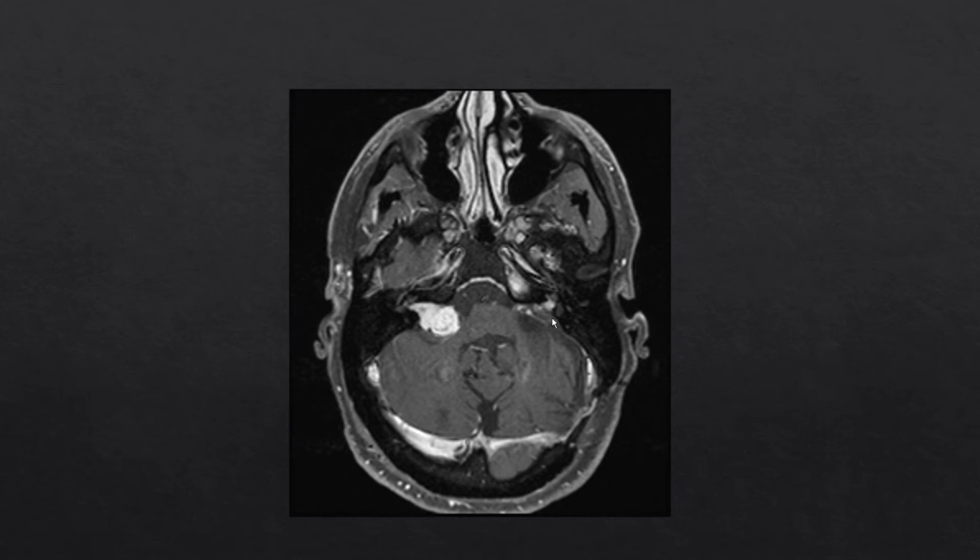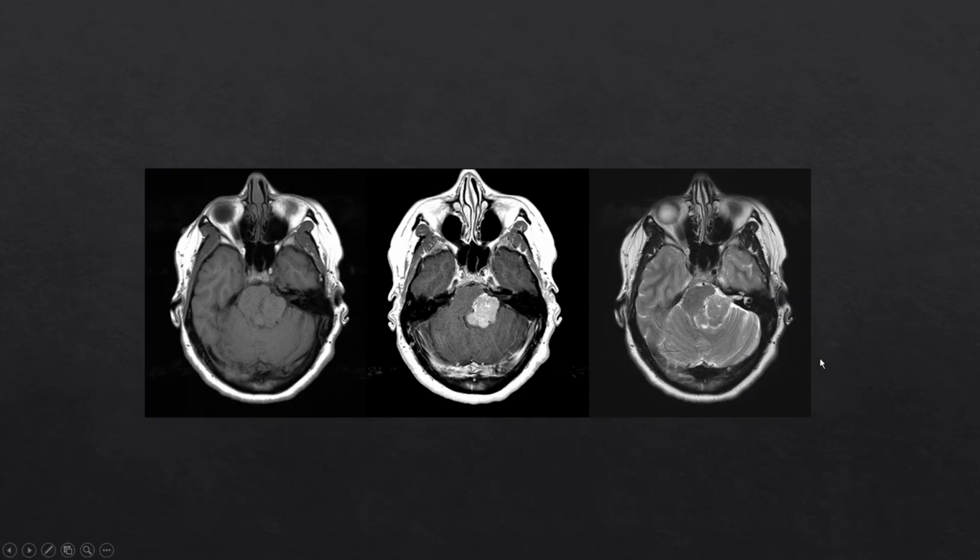Now, bilateral schwannomas are diagnostic of NF2, but bilateral enhancing masses in the IAC could be something else like metastatic disease. Here we have another case of a left cerebellopontine angle cistern mass with homogeneous post-contrast enhancement. We see a cleft of CSF between the mass and the pons and the cerebellum. This mass does not extend into the IAC, but also does not have a broad area of attachment with the dura. In fact, it has a narrow area of attachment with the dura.